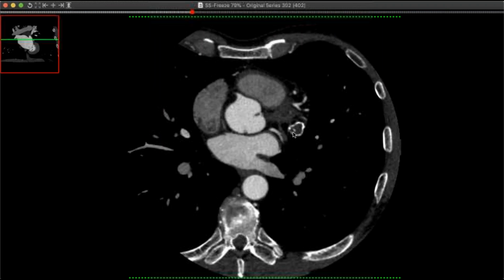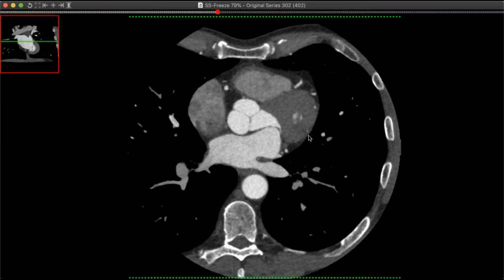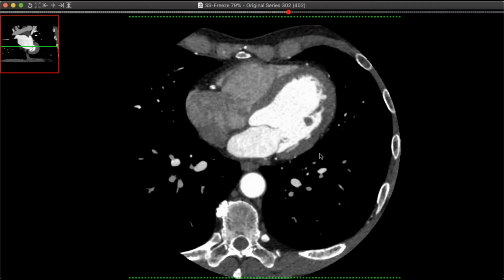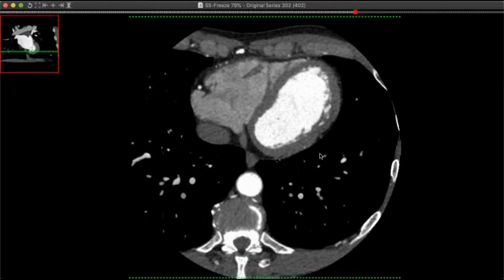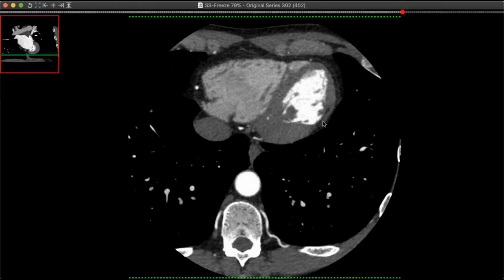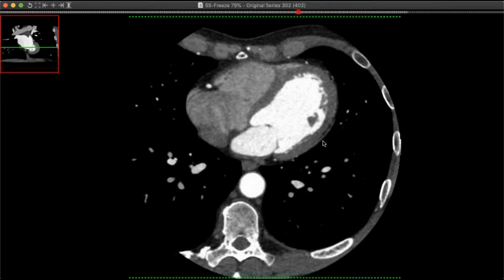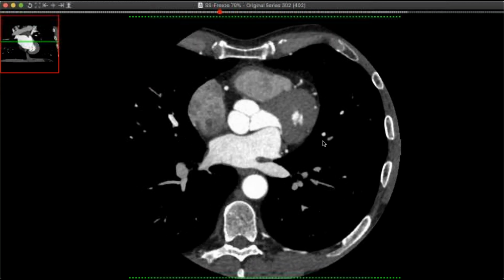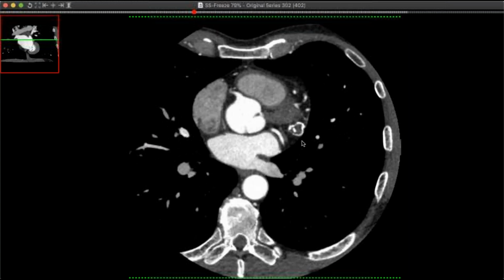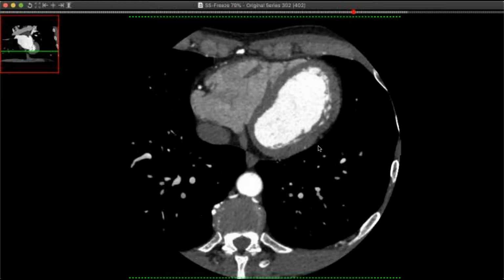You'll see that there's what looks like a thrombosed aneurysm, and then this little artery continues. But what's really kind of cool, and I'll see if I can window it right, is if you go down a little bit further, I think I got the right series, there's a little thinning right there distally. So there's a little old infarct, a very small territory, just distal off this branch. And from what I was told, the source of the PVCs is mapping to this area of the myocardium.